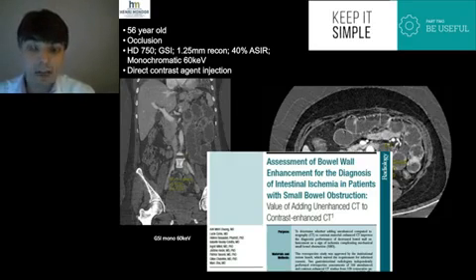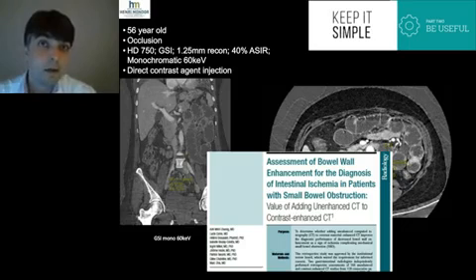And if you inject directly with IV contrast, then you miss that hyperdense segment within the bowel wall, and you lose the confidence in the way you're either seeing the enhancement of the bowel wall or you're seeing a spontaneously hyperdense bowel wall, which is actually suffering from bowel wall ischemia. So with spectral imaging, the idea is that with a single phase injected directly, you can still benefit from the non-enhanced phase. And here is how it works.